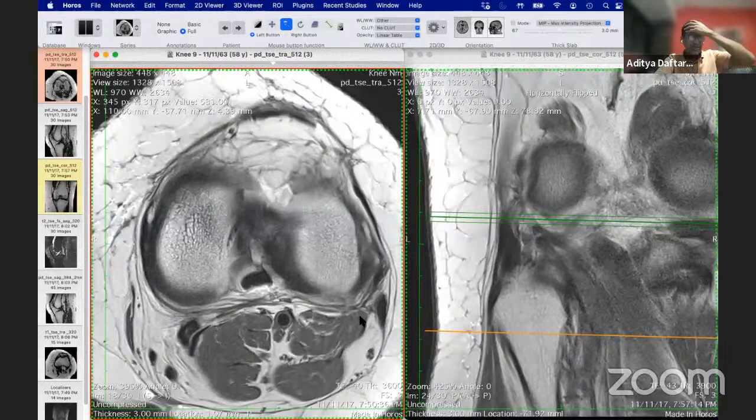Now, differences in pediatric ACL MRI findings compared to the adult. The big difference in pediatric ACL injuries compared to adult injuries is that with pediatric injuries, one tends to see more bony avulsions at the tibial attachment than ligament tears in the mid-substance. So we tend to look more for the bony avulsions, and in those cases, one thing I would do is talk about the size of the bony avulsion, because if it's big enough, then somebody may want to put a screw back and fix it.